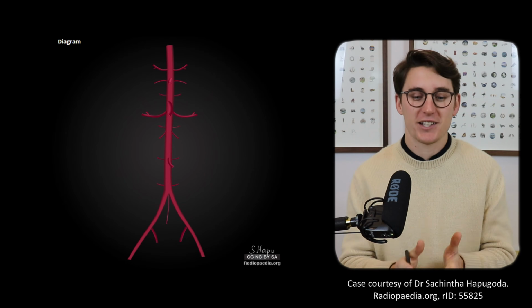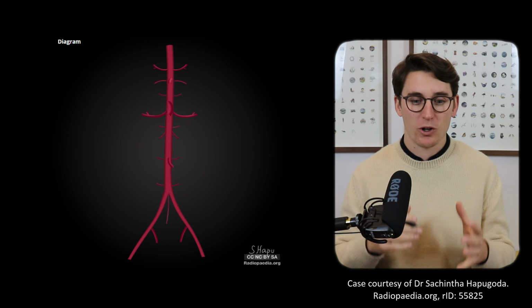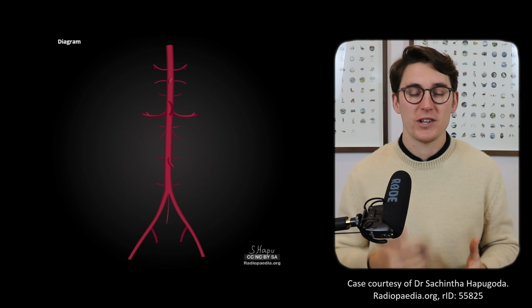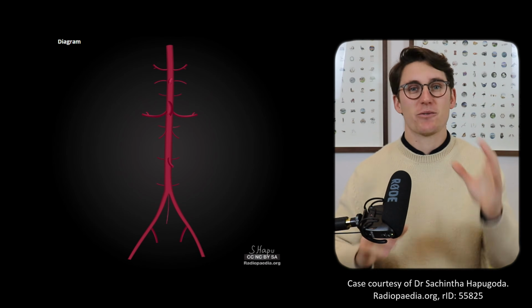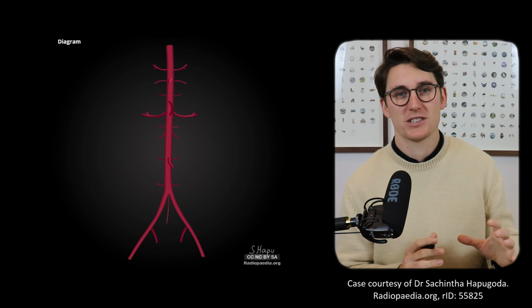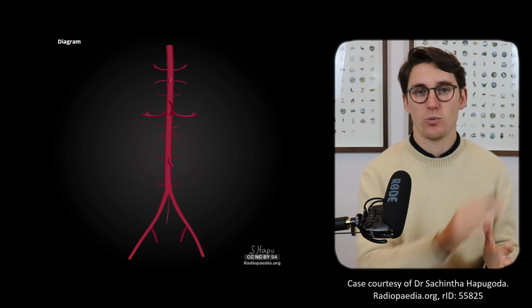Now you may have seen a diagram like this before, and what I find really difficult, especially with abdominal vasculature, is that we have this straight aorta coming down through the abdomen, but all our organs have rotated around one another and the vessels have rotated with those organs. It can be a little bit confusing as to where the vessels originate as opposed to where they actually end up.